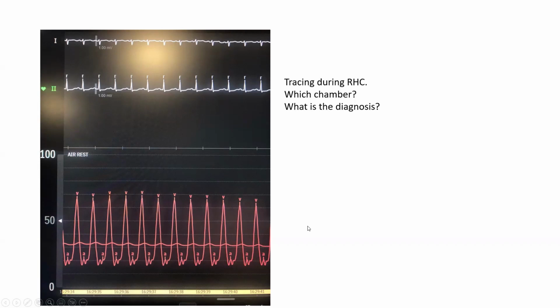This is likely a wedge pressure with a huge V wave. Now, could it be RV? The morphology in diastole could be RV, that upsloping with an A wave. However, again, in systole, the RV is not peaky, narrow like this. The RV will be more rectangular, plateaued. It peaks throughout the STT segment. So this is not an RV morphology.